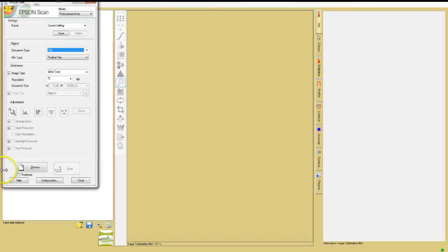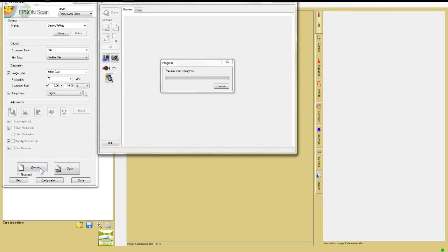Now place the calibration films on the scanner, being sure to have all the films in the same orientation and along the central axis of the scanner parallel to the scan direction. This placement is essential to minimize the lateral placement artifact and avoid those uncertainties. Click the Preview button to obtain a preview image in the Preview window, and run Preview 5 more times to warm up the light source.